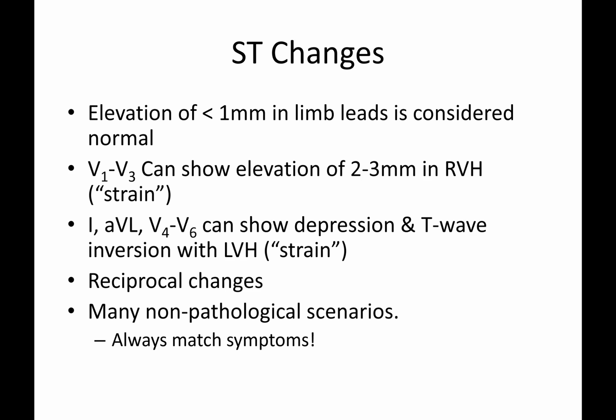So your ST changes. I know people have had discussions, you've probably heard it during your career, that it's not pathologic, or it's not a true MI until it's greater than 2 millimeters.